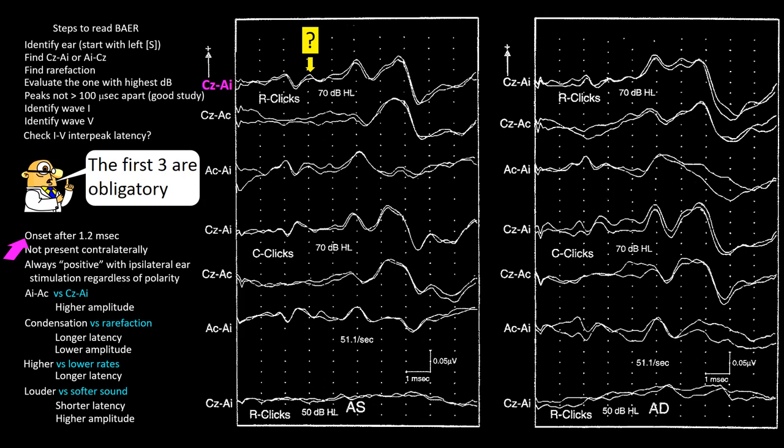Then the first question is, is the onset after 1.2 milliseconds? Yes, it is over 1.2 milliseconds. So this item is met.